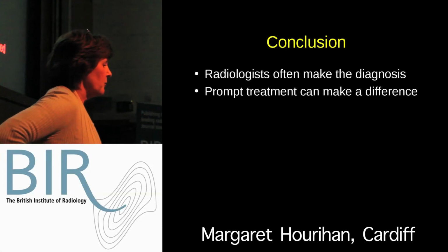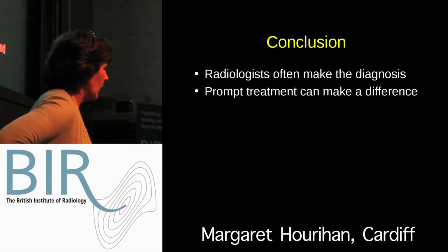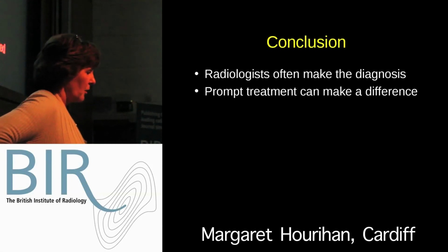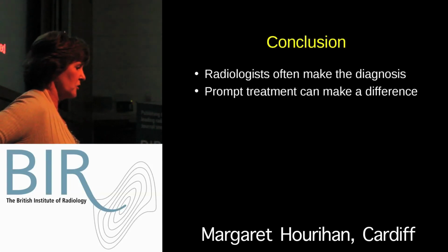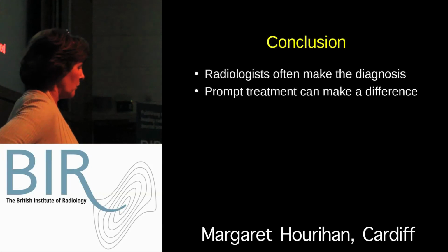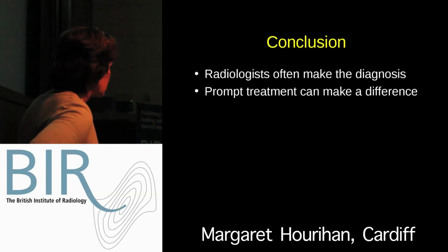We've reviewed the imaging features of infections that we commonly see in the UK. It hasn't been all-encompassing. Note the history and the examination. It's important to us as clinical radiologists, and just beware of the normal scan in a patient with decreased conscious level. And as radiologists, we often can make the diagnosis, and prompt treatment can make a difference.